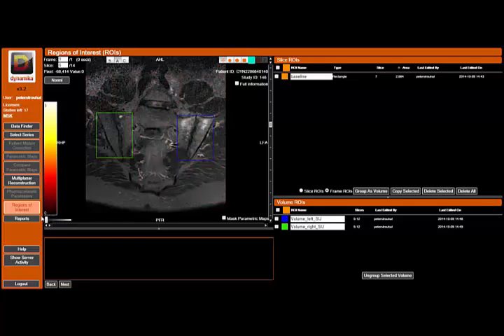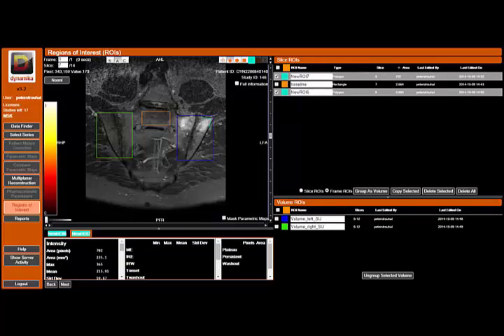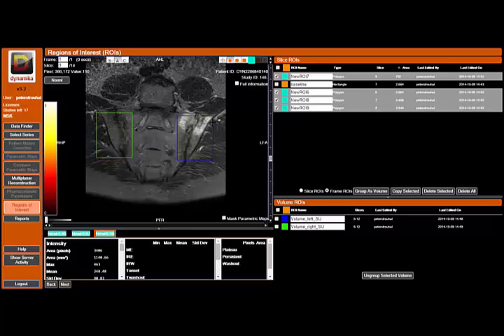So having decided whether you're going to apply it to a single slice or the whole stack or a subset of the stack, for the larger regions of interest, you can then also fine-tune the regions of interest within that. So you can draw regions of interest, much smaller ones, around specific foci of abnormal signal intensity that's obvious to the eye as well as obvious on the color map when you adjust for background. And you can check these by turning the color map on and off, or effectively phasing it in and out to check where you're drawing your regions of interest, the smaller ones.